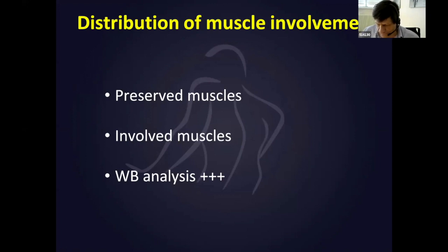While abnormalities may be very recognizable in the lower limbs for some of the myopathies, others need scanning of distant regions of the body to find more conclusive features, and therefore the whole body scanning technique will often be more contributive. This is the case for most congenital myopathies, in particular those presenting with mutations in selenoprotein, dynamin 2, ACTA1, and nebulin myopathy.